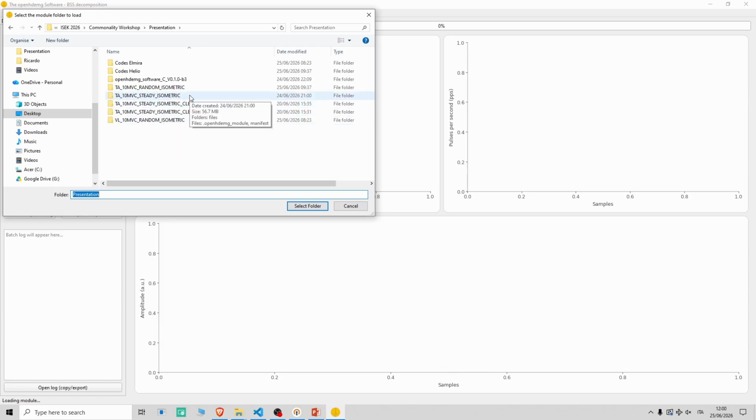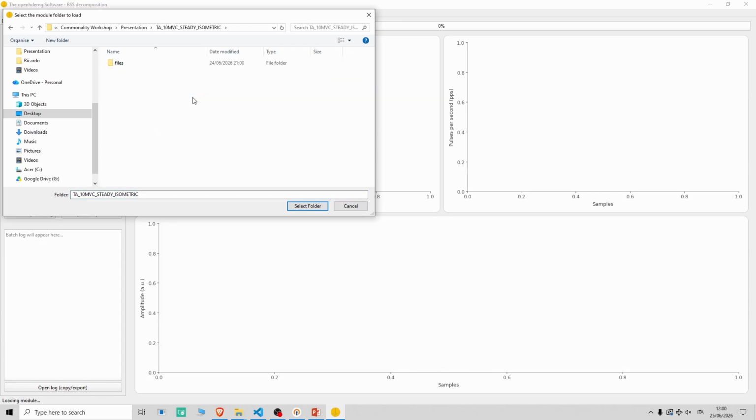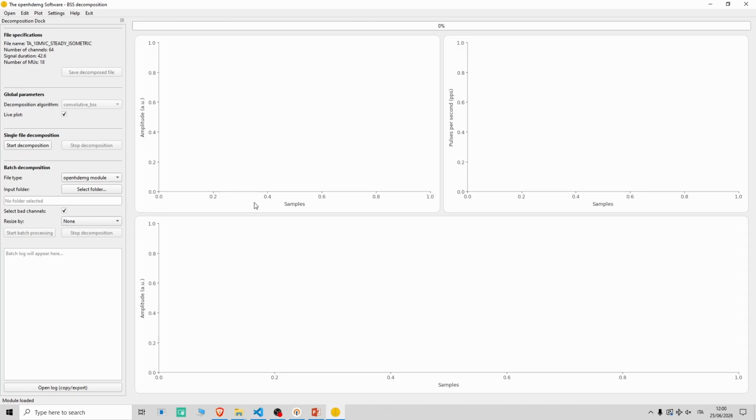So now we use one file that we use for testing the decomposition, and then we will use the same file at the end of the presentation to understand what happens if you don't do decomposition and especially cleaning in a proper way, because coherence analysis is extremely sensitive to the quality of the cleaning.